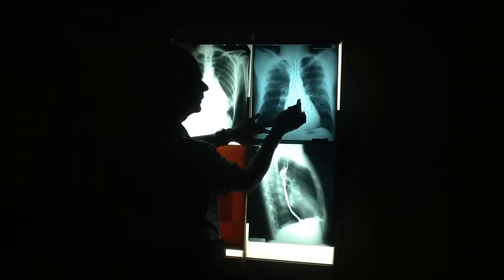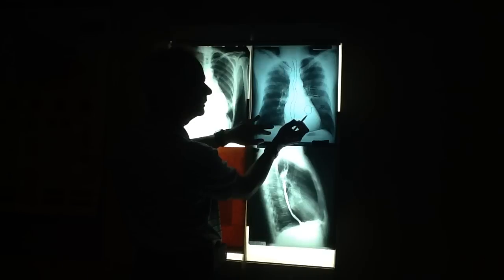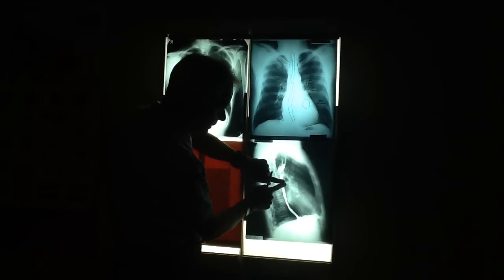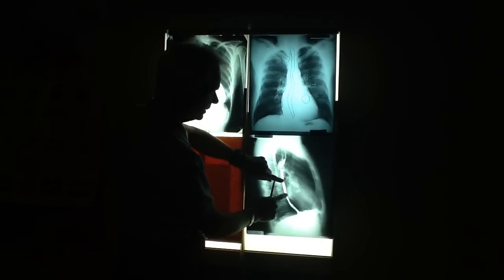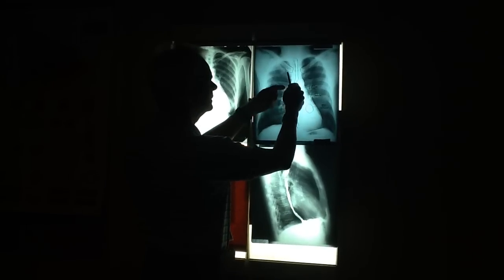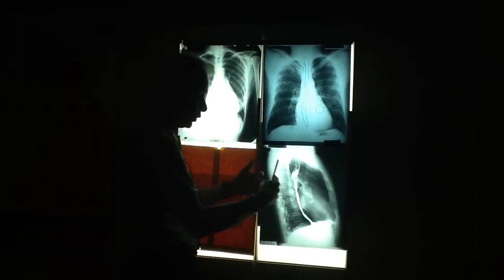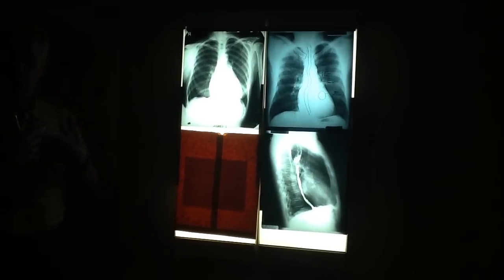This one over here, I just put the overlay on top of this. See it? This prominence, left atrium, again. And what it's circling here is mitral valve calcification, which is right here. See it? Now, this is a barium swallow. The reason for the barium swallow is the left atrium's pushing a little bit against the esophagus. Not a great deal, a little bit. There's a little bit of hilar prominence, a little bit of engorgement in the upper lobe veins, but this is calcification in the mitral valve. And the mitral valve is located more posteriorly in the heart. Left atrium is the most posterior chamber.